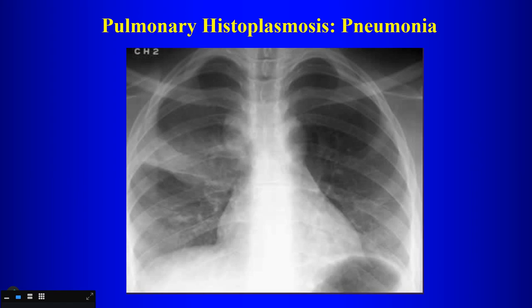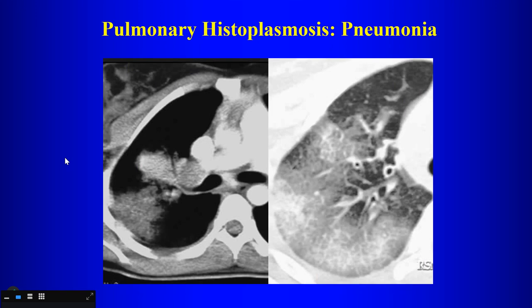Tuberculosis, sure, certainly. That can give you a consolidation with lymphadenopathy. What else would be in your differential? Cancer, of course, yes. Is this atelectasis? Is this post-obstructive pneumonia? You do have right paratracheal lymphadenopathy. Of course, cancer also has to be in the differential if you come across an X-ray like that.